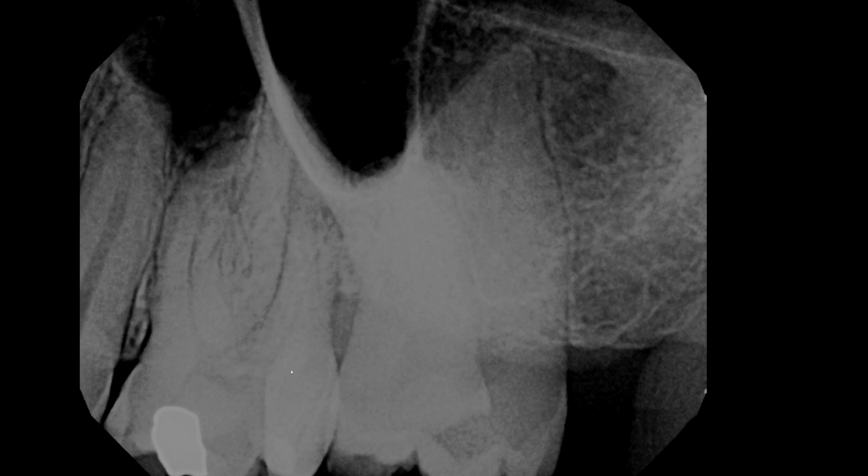Generally speaking, third molars tend to have a wider range of pulpal and root anatomic variations, and they tend to be smaller or shorter rather than larger. So based on the root morphology alone, I would expect this to be the third molar.